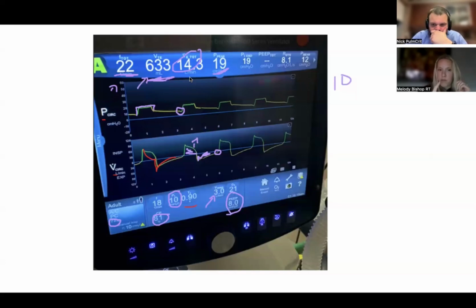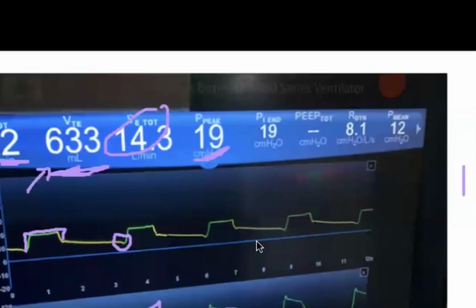One thing though that I would probably do is shorten the inspiratory time a bit, because I'm seeing it, not so much in every single breath, but in breath one, breath two, and breath three specifically, that the flow, when it finally starts to turn down, drops so powerfully strong. It makes me think they're actively breathing, trying to push out. And then we do have a slight uptick in that pressure that makes me think maybe there is some cycling or delayed cycling.